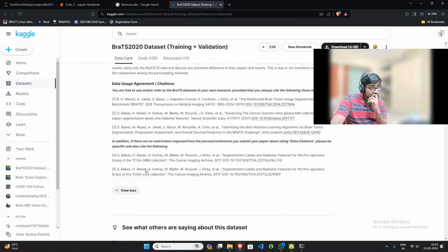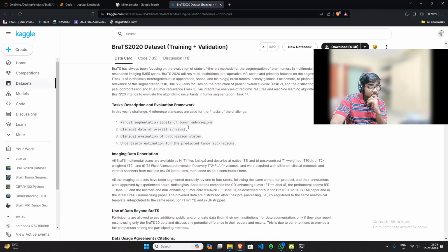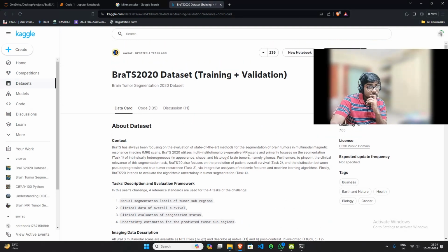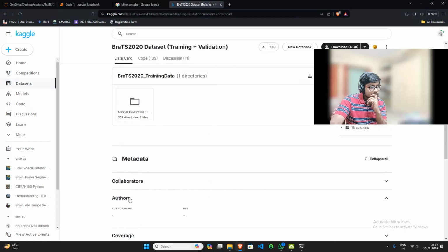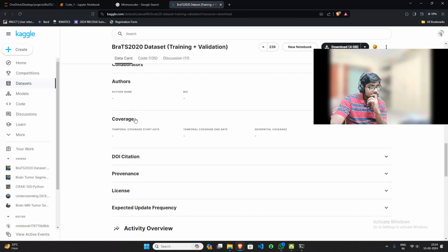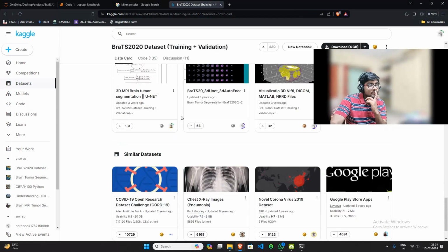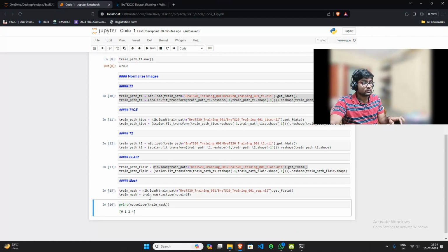Anything written here? Nope, nothing written here. I don't know. I think there are different types of tumors. Okay, we'll see that later. When we print the mask data, we can understand in a better way. But for now, we want to just say, okay, one thing: there's 0, 1, 2, and 4.